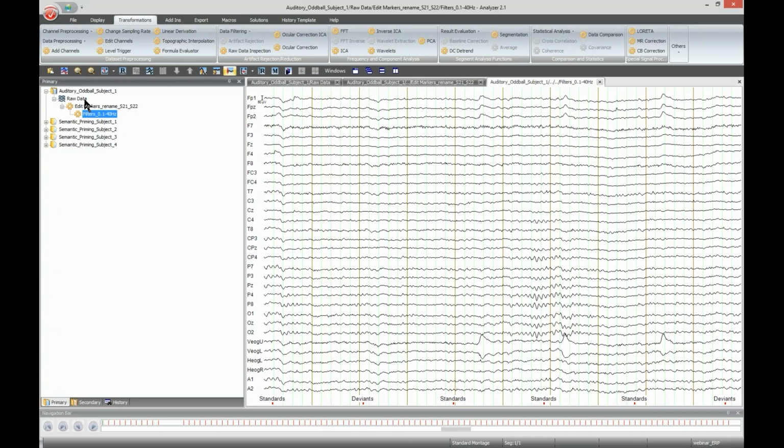FCZ is likely to be affected by the P300 in our oddball paradigm, as the P300 is usually most prominent at midline sites from frontal to parietal electrodes. Hence, a different reference, which is further away from the electrodes of interest, may lead to better results. Often a linked mastoid reference is used. Linked means thereby the mean of the two mastoids, as we did not physically link those electrodes during recording.